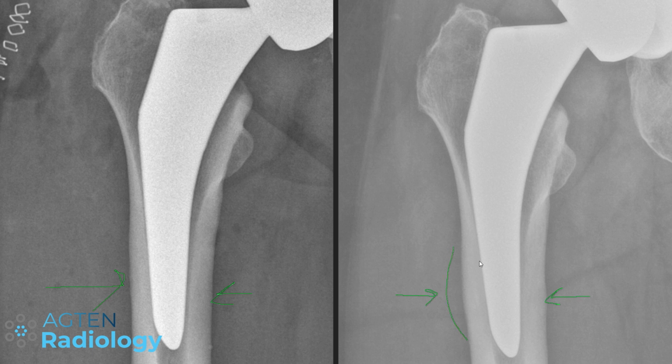So this is also a sign that, when the patient has this stem, and you can see it's kind of like pressed against the cortical bone. If he's walking around, there is a lot of pressure coming through the body down here. And it also has this distribution to the sides. So there might be a little bit too much pressure, or a little bit more pressure than usual, or the bone is a little bit weaker to cope with this pressure, and you get these periosteal reactions here.